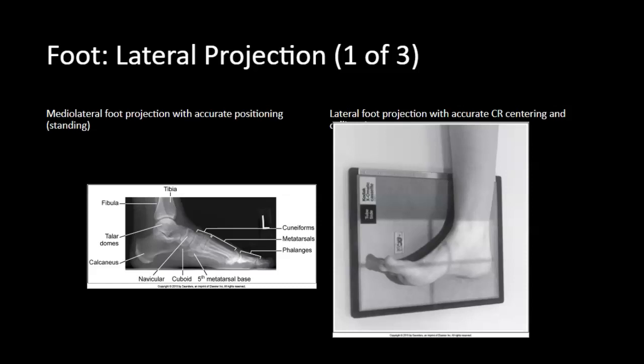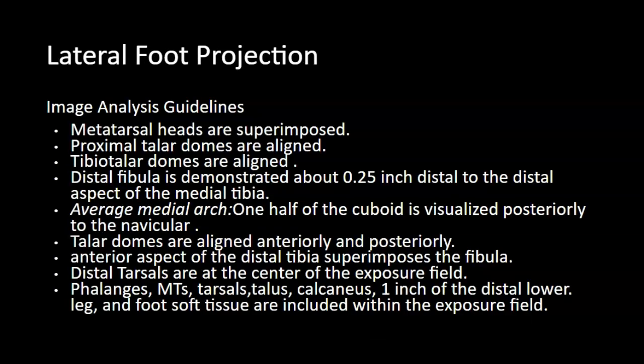The distal tarsals should be at the center of the exposure field. The phalanges, metatarsals, tarsals, talus, calcaneus, and 1 inch of the distal lower leg and foot soft tissue are all included within the exposure field. Here are those guidelines.